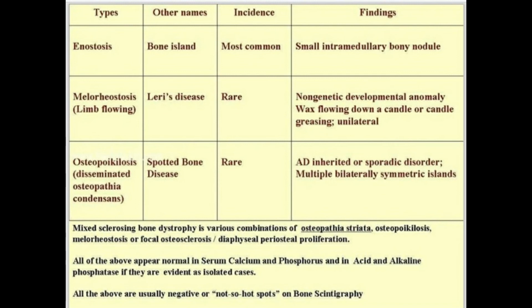Now finally, the purpose of this quiz is to emphasize the importance of X-ray appearances in bones, which can be benign or normal variants in known malignancies, especially in renal or lung or breast malignancies. In our case, the first 3 are old X-rays done a few years back, and the clinicians were very sure that they were benign, but they wanted to confirm it by other studies like PET.